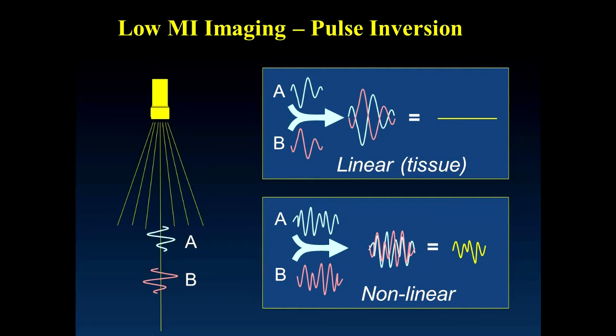The imaging modalities that are currently used for contrast-enhanced studies are no longer simple low mechanical index harmonic imaging. To further optimize microbubble signal to tissue noise ratio, a number of so-called multi-pulse techniques are now being used. The first example of these techniques is pulse inversion imaging.